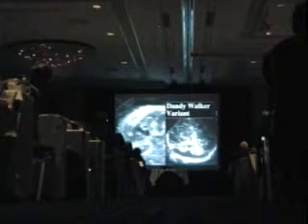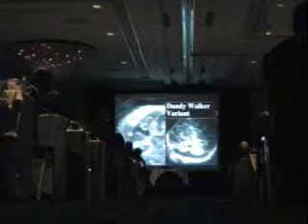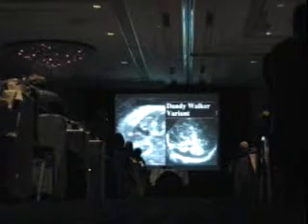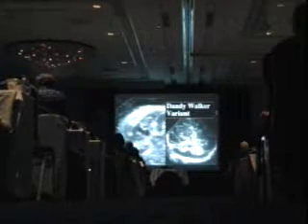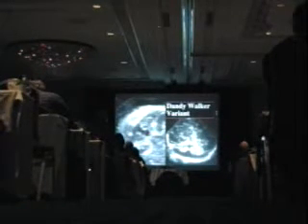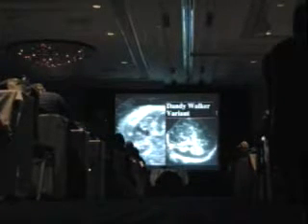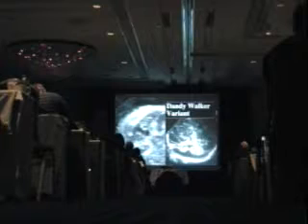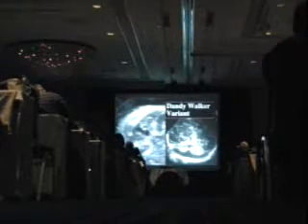This is the Dandy-Walker variant, and you can see two different cases. This is the cerebellar hemisphere on one side, the other side. This is that little keyhole connection between the fourth ventricle and the cisterna magna, where the inferior vermis does not form or does not close. And here is a similar case. Slightly smaller cerebellar hemispheres, but still they do sort of meet in the middle.